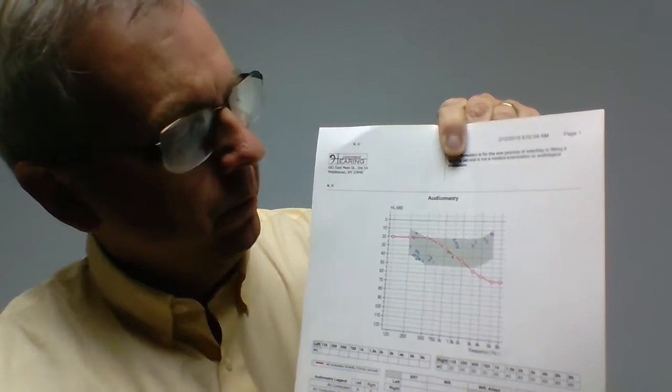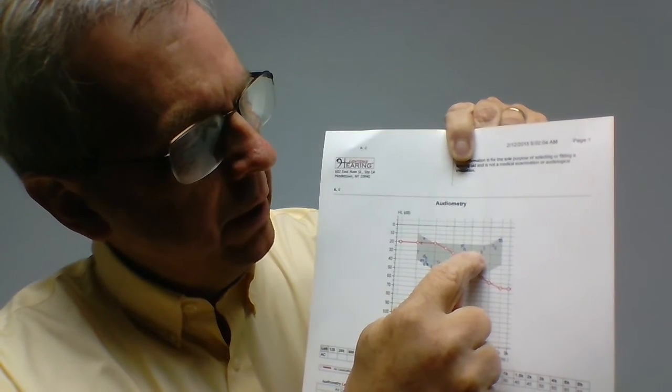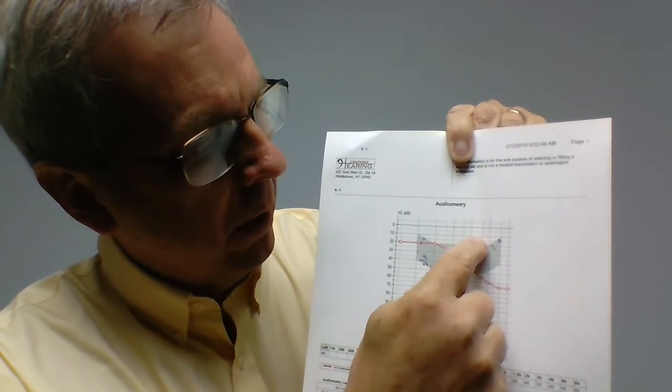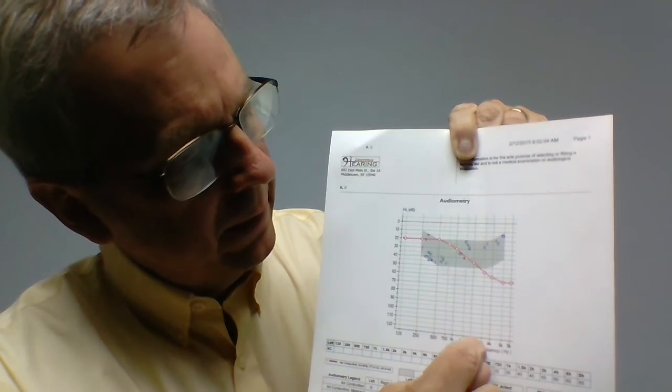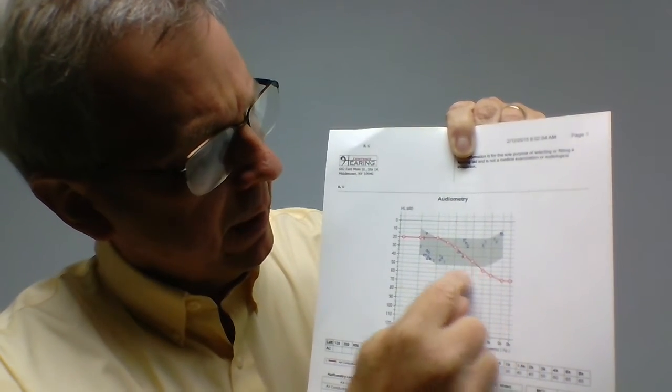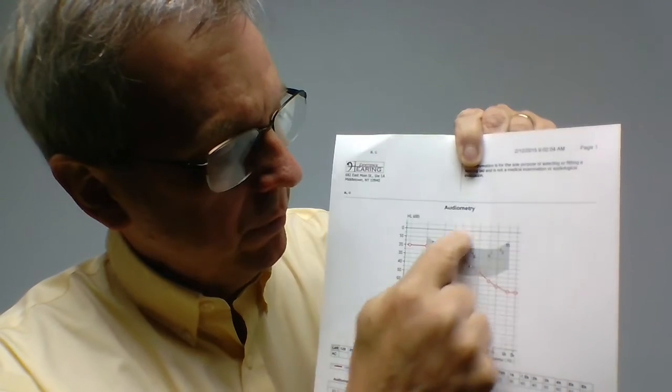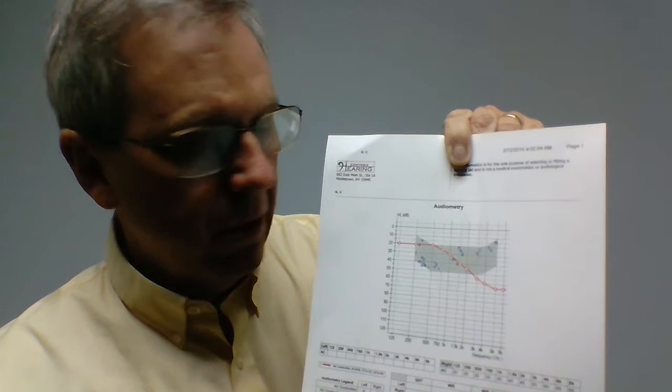This particular guy, a lot of people mumble for him because he doesn't hear the S sound, the F sound, the TH sound so well. So the high frequency consonants this guy doesn't hear so well because he detects, if I'm out here at 4,000 hertz and he's detecting it at 60 decibels, well, the S and the F are up here at 20 decibels. So if the S sound is at 20 and he doesn't hear the sound until 60, he misses these sounds most of the time.